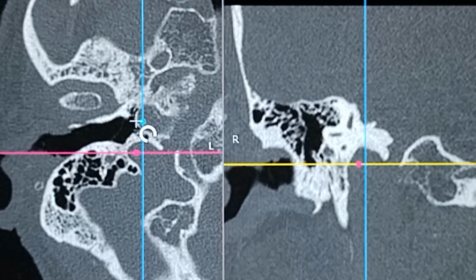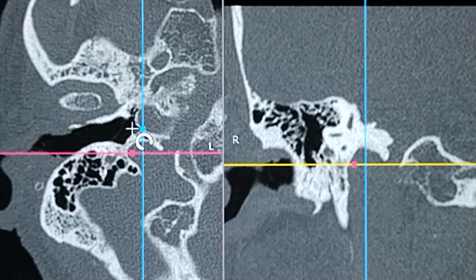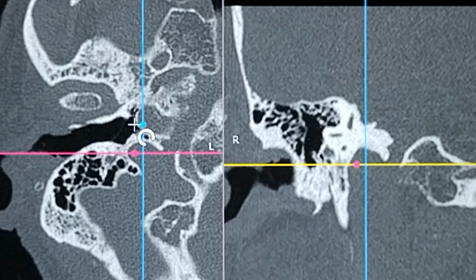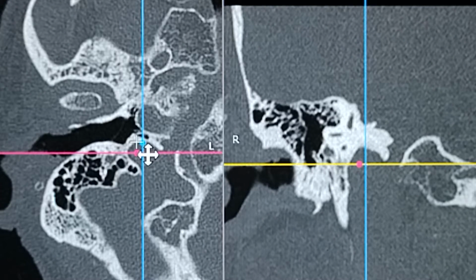So basically a part of the artery can prolapse into the middle ear cavity and give a pulsation behind the tympanic membrane. If a surgeon directly goes inside and opens up and thinks that it is a soft tissue and just tries to remove that, the surgeon is basically unknowingly hampering the patient's ICA. So always get an MR angio or basically an MR scan to know for sure whether it is carotid or not, or basically any other tumor.